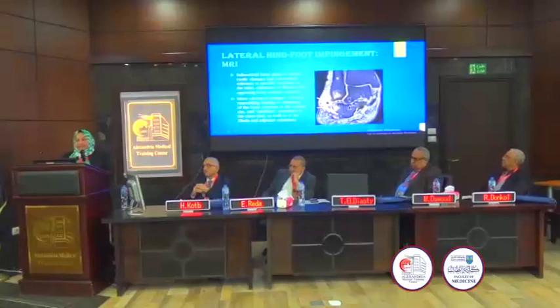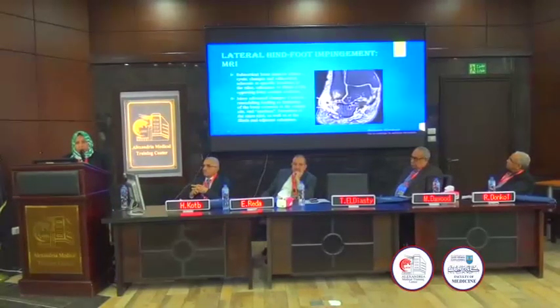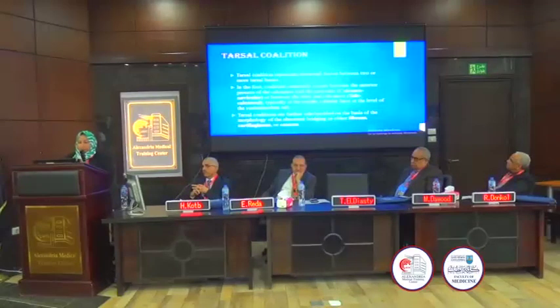And MRI gives a characteristic appearance of this abnormality by presence of edema at this characteristic location, the lateral aspect of the calcaneus and the distal end of the fibula, with progressive bony remodeling and flattening of these opposing bony surfaces at the contact site and neo-facet formation.